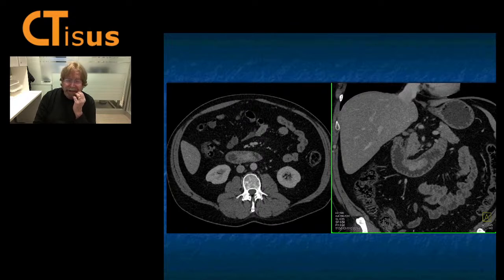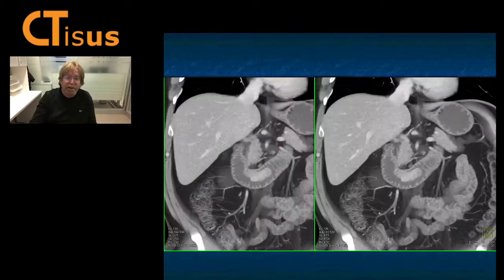I'm not thinking a met, could be. I'm not thinking a GIST. GIST can be intraluminal, but they're usually exophytic. They just tend to be more vascular. I'm thinking neuroendocrine tumors because this is a duodenum, but neuroendocrine tumors are typically more vascular. Okay, we've got to go with the vascular things. But I don't see the vascularity.